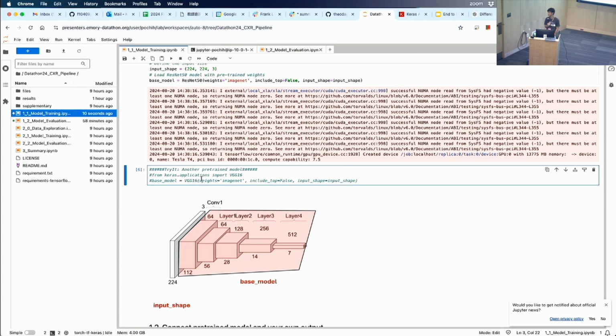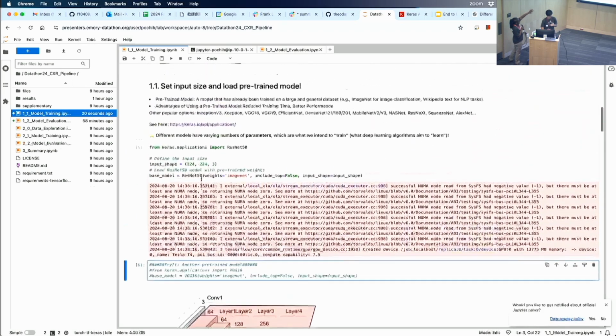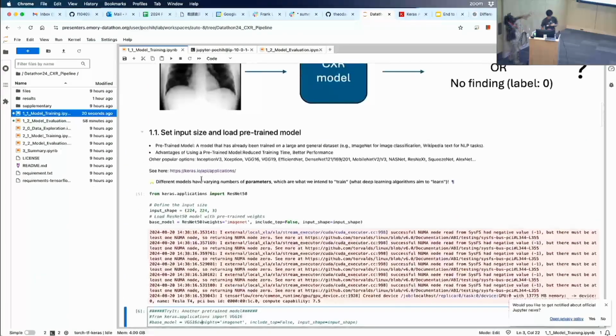Good. So if you look slightly up, yeah, here, don't go. Pretty much the code here is saying from Keras, there is an application. This is a line you can put into GPT, and it's going to tell you what it's doing. This is a common syntax of Python. You're going to import ResNet.